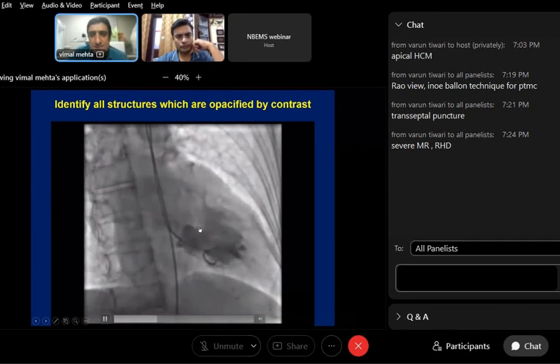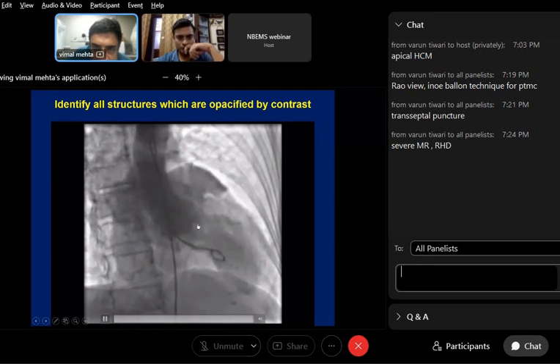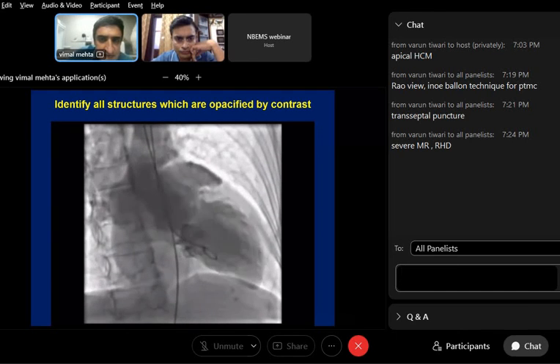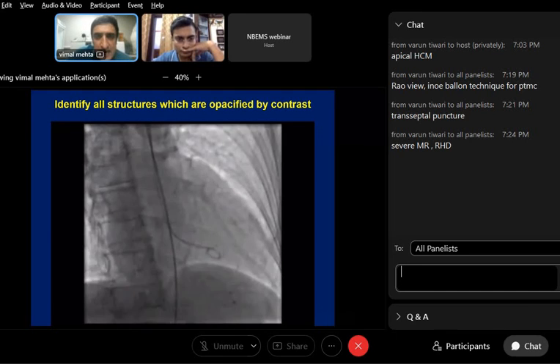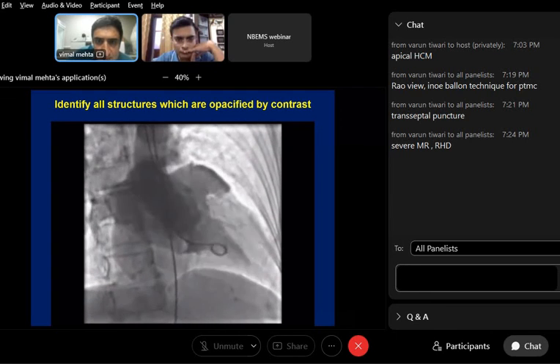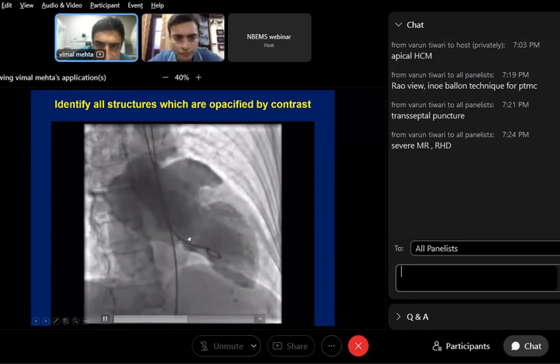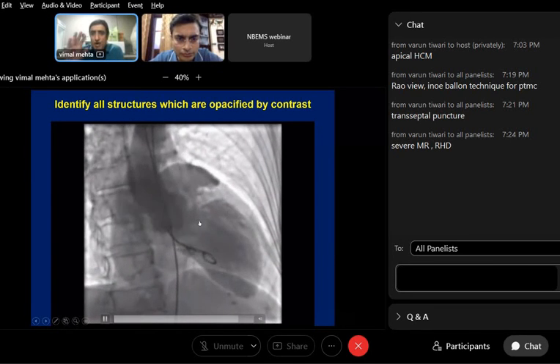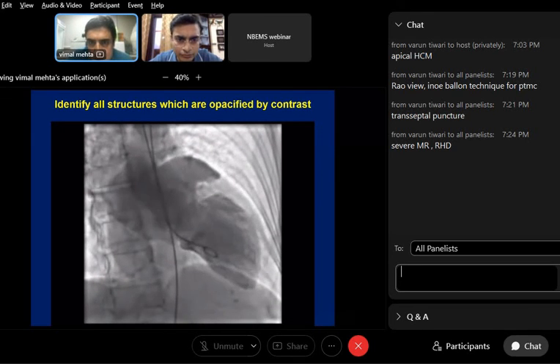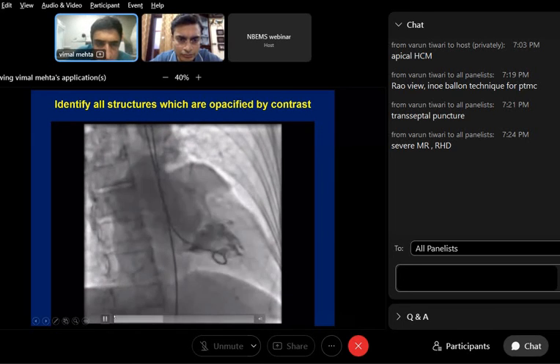Okay. See, focus over here on these leaflets. Focus here. I showed you everything. I have taken great pains to collect these and arrange them in a proper manner, so I want a full impact. You will rarely see these kind of angiograms these days. See the leaflets. Normal leaflets you are not able to see. They are so thin. See the leaflets carefully.